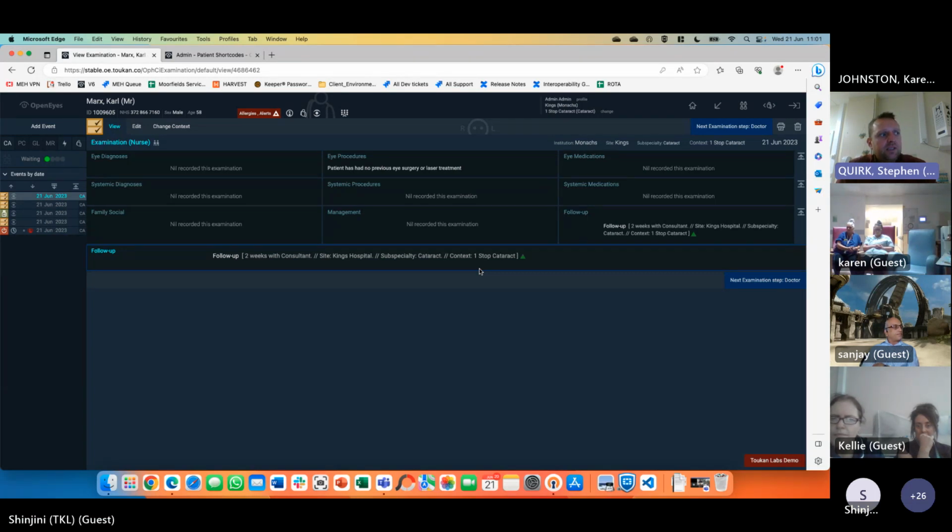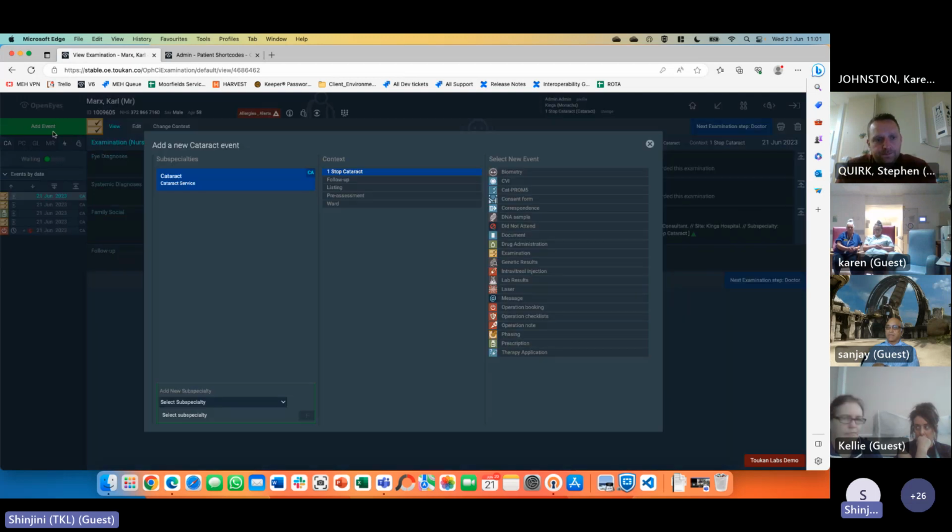Mrs. Heen asked how we access radiology images, and can any images from another service be uploaded onto the system? Yes, you can upload anything if it's in a JPEG format, all in the document event. You also will be integrated for biometries. And Sanjay, do you want to come in here? I'm not very good with integration bits. What kind of things come in from other systems?